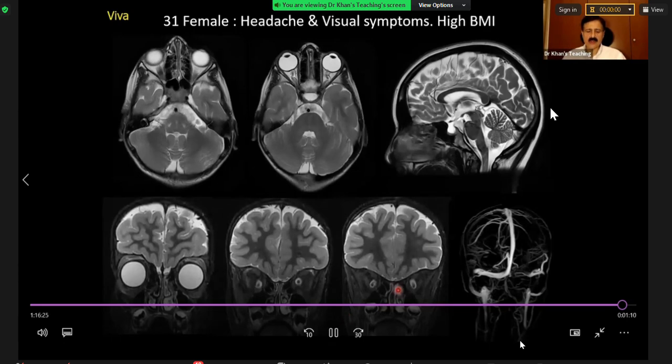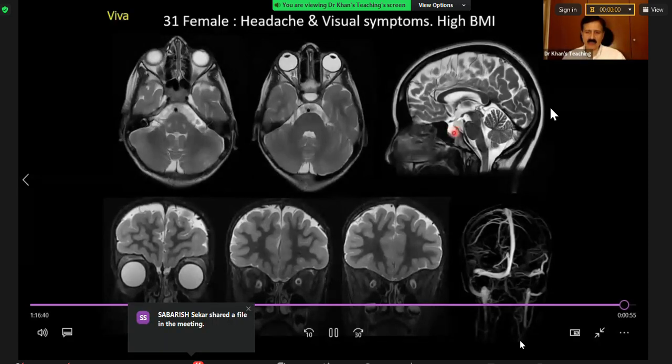So what happens is, radiologically speaking, you have to pick up, there are many findings, but the main exam findings are partial empty sella. Partial empty sella can also be an incidental finding, but you have to pick up other findings with it. Partial empty sella. Meckel's cave will be prominent. So this is Meckel's cave, which will be prominent.